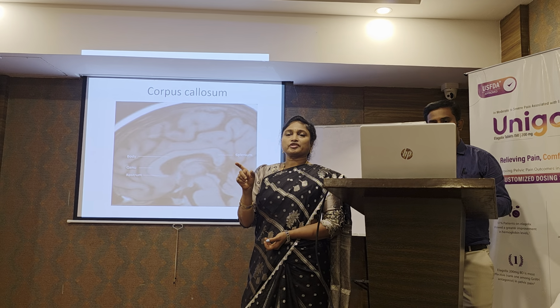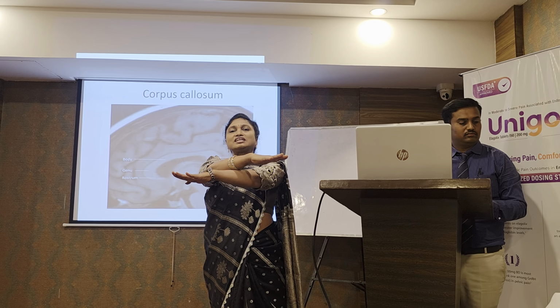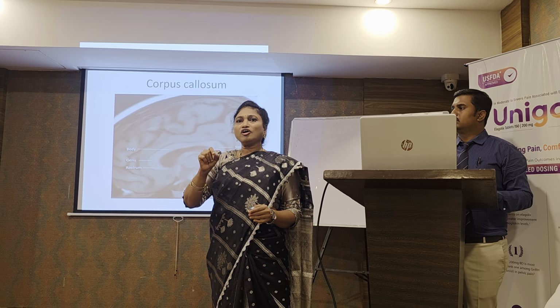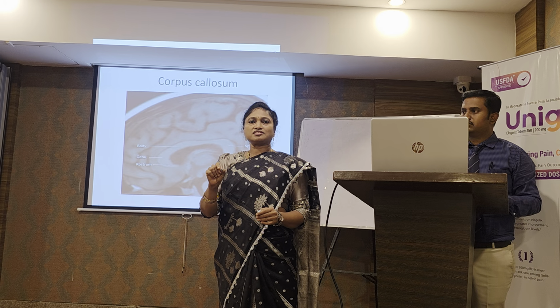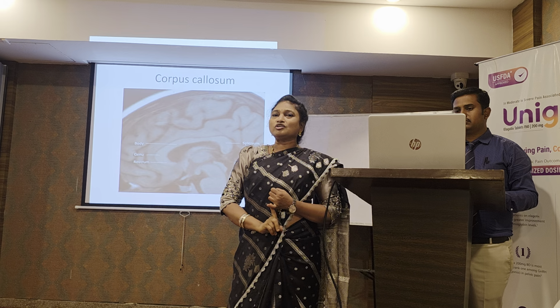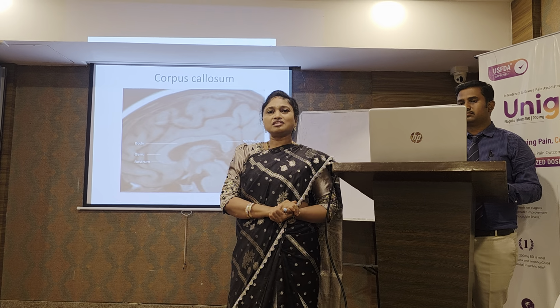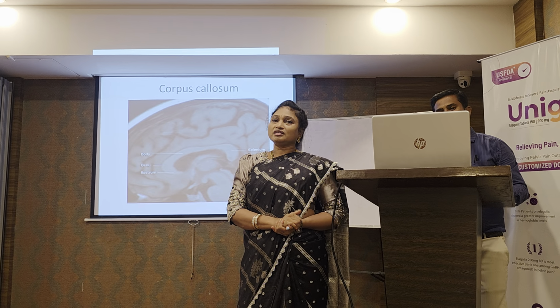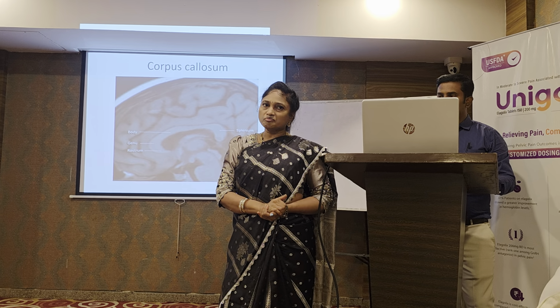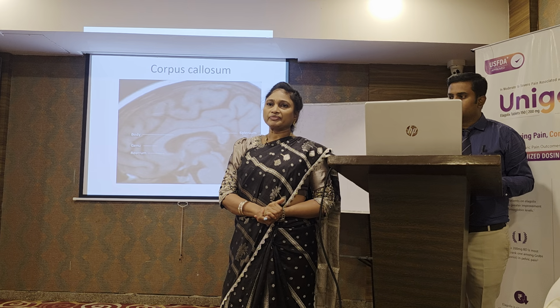What is corpus callosum? Corpus callosum is a big bundle of fibers that cross each other and connect the right brain to the left brain. Even if there is a small hypoplasia or agenesis, it means there is no coordination between the right brain and the left brain. It will lead to a lot of motor, sensory impairment, as well as complex thinking impairment, even developmental problems in the fetus. This is a lethal anomaly. We should not miss it, because all these are not compatible with a healthy child. Next one.